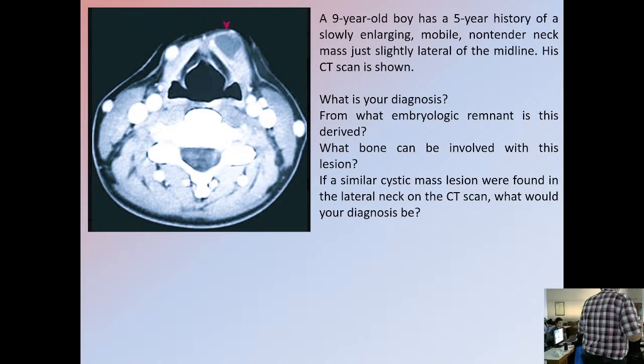One thing is that, taking into account this consistency, this could be necrosis within a lesion, forming a cavity, a cavitated lesion. This is one thought. It's logical. What else can you think that it might be, and not be a mass? It could be a cyst, and that's the cavity of the cyst.